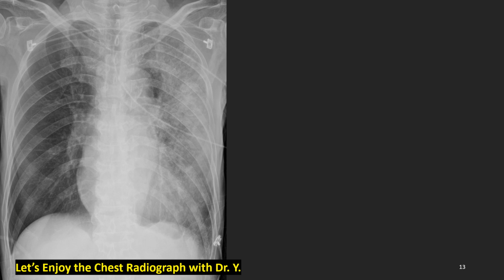First of all, at the aortic arch level, have you ever heard of the Luftsichel sign? That's a German word. In English, the air crescent sign. That is the anatomically left lower lobe superior segment. That means, in this case, the left lower superior segment is okay. And the aortic line is okay. That means the left lower lobe is okay.